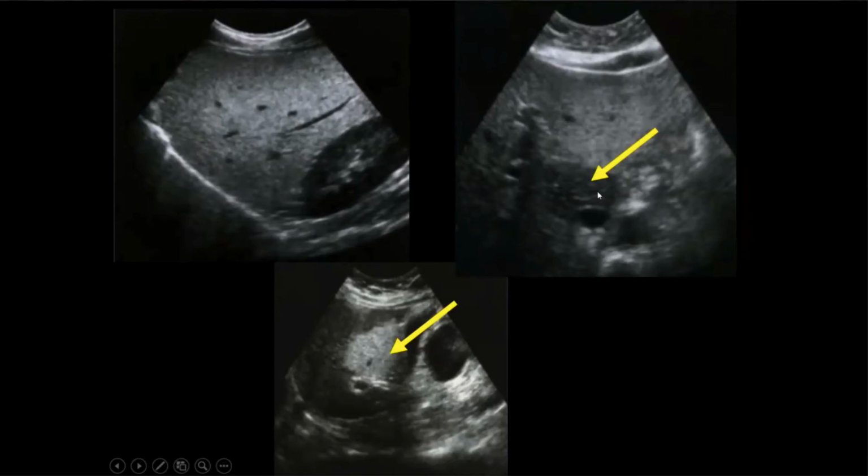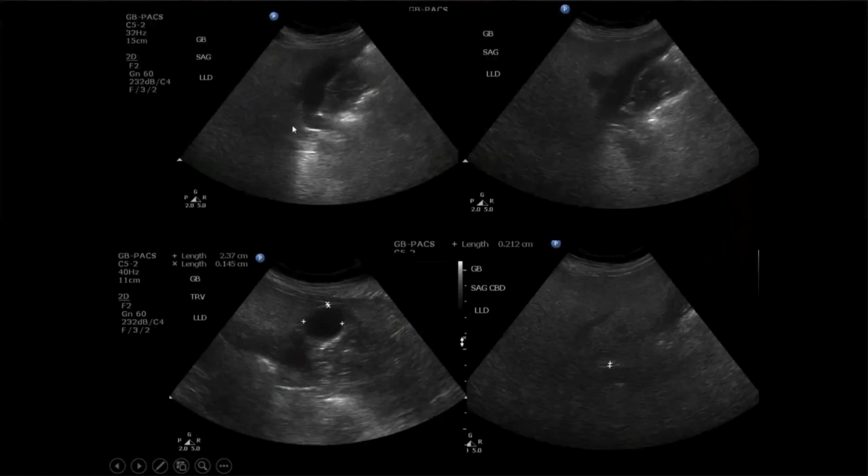This is just another example. The gallbladder is here, and you'll notice you have a really hard time seeing all of the structures in this image, but there's this funny thing right next to the gallbladder. This is another example of fatty sparing. So this is an area of focal fat sparing in an otherwise really fatty liver. Hard to see the structures, kind of echogenic, and then it has this nice area of focal fat sparing.